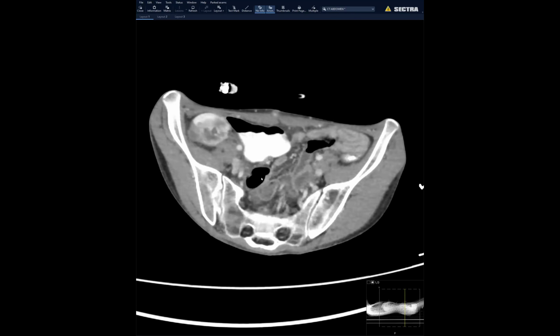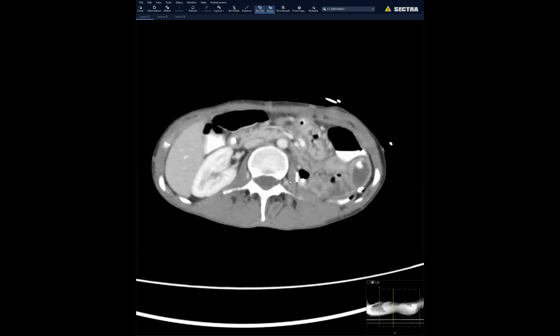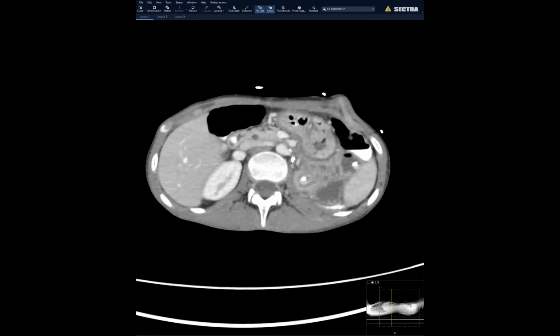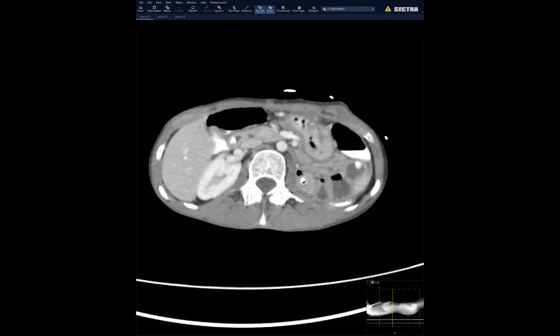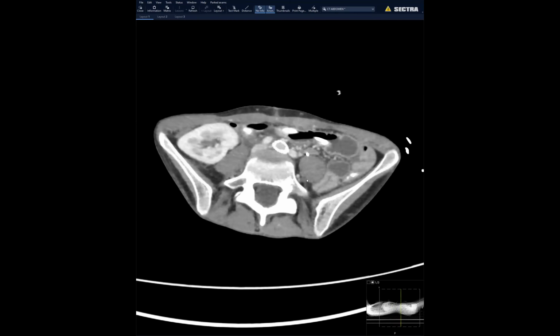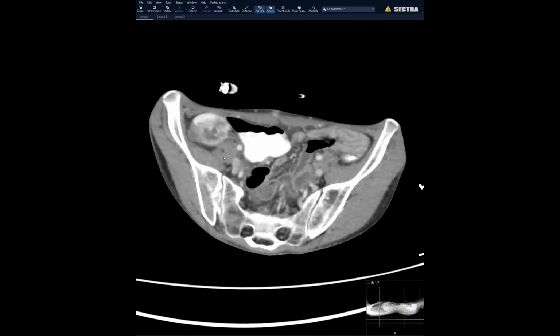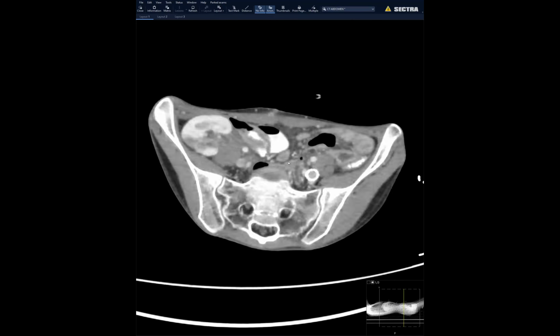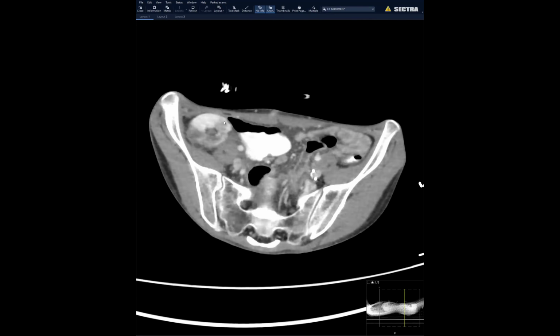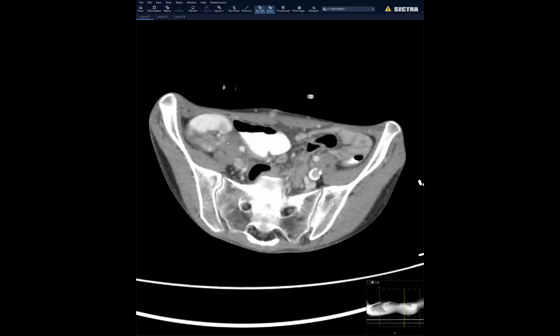Sorry, in native, what led to that? Why did they do that? Was it renal function deterioration? Nutcracker, I suppose. I was going to say usually for Nutcracker, they just move the vein over the SMA. Yeah, I don't know why this one they moved it. Maybe she had May-Thurner too, because there's a stent, presumed to be from May-Thurner. It's just a lot of stuff. But then she came with this finding in this newly moved kidney.